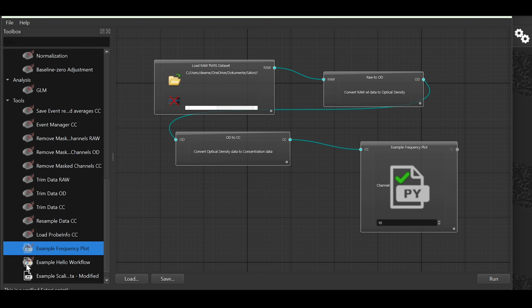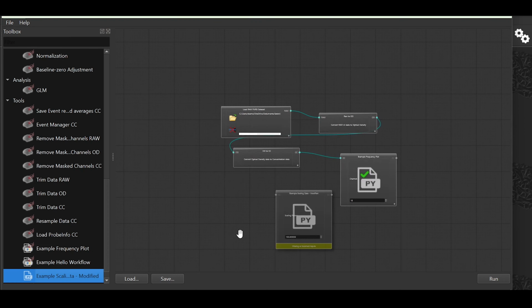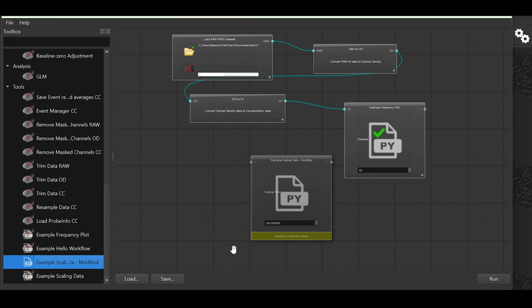There are two types of Python scripts: inbuilt scripts supported by NIRx and Brain Innovation, and user-developed scripts, which have a different logo. You can also see the different logos in the background of the workflow module when placed in the working area. Satori already comes with inbuilt Python scripts. These come with proper documentation and are tested and fully supported. Python-based solutions created by users are called user-developed. These are written and used in full responsibility of the user and are not supported.